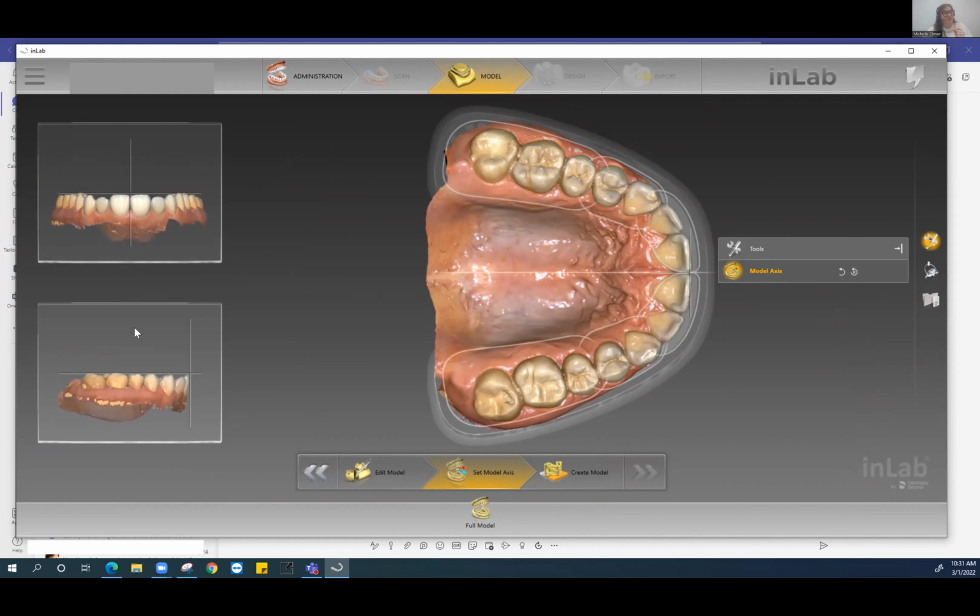And then again, looking at the occlusal plane on the left-hand side. We're not too concerned if the patient has a really broad arch that's slightly outside of these horseshoe shapes, or if it's more narrow and on the internal aspect of it. Both are correct. Again, line up your midline and occlusal plane and your facial lip support, and that'll be key when it comes time to designing a denture.